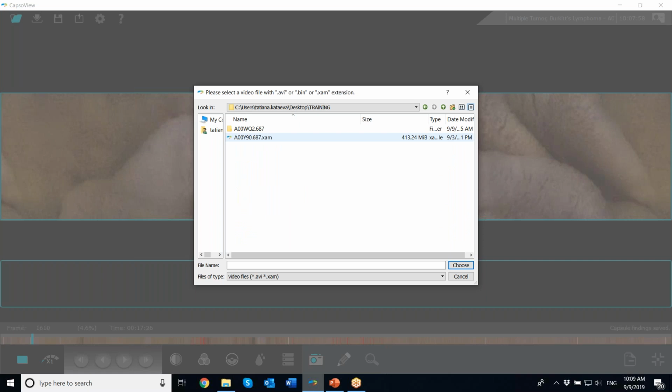Well, usually you will see this one, or if the video file has been unpackaged, that will be the folder with the name and it will have supplemental. So basically it is an unpackaged XAM file. And this is the main video, and supplement has the supplement video. It is important to have both videos, main one and supplement, because that's how it can be combined in one full video. So without supplement, you cannot open the video and the study.